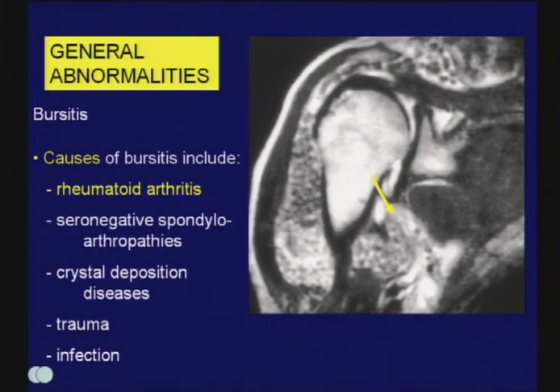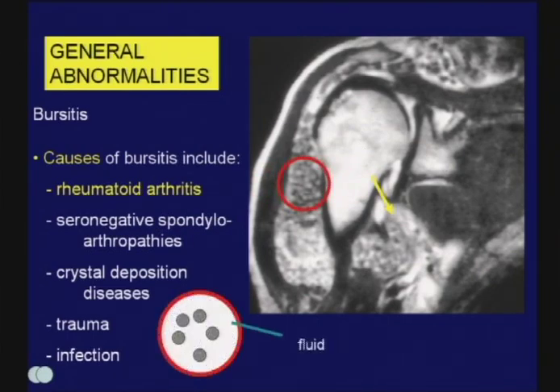As we'll talk about later, that is in fact one of the largest bursae in the human body. As you look at the signal intensity here, it was also impressive how we could see a background of bright fluid on a fluid-sensitive sequence and well-defined nodules of low signal. These nodules represent rice bodies, and they're characteristic of processes that produce chronic synovial inflammation. The classic disease is rheumatoid arthritis as present in this particular patient. But I would remind you again, when you see rice bodies, consider also tuberculosis as a possibility.